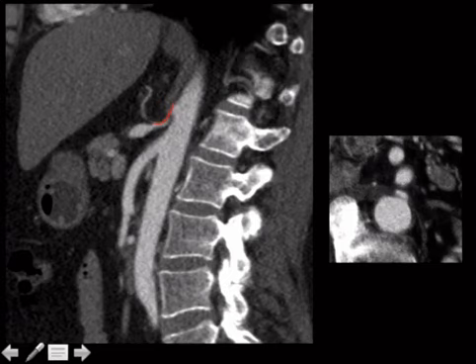Probably have seen this a few times, just going straight down. That's how, if someone was going to show you this particular pathology, that's how they would show it on axial. It's much sneakier on axial. It would be way easier to tell what was going on sagittal. In fact, it would almost be too easy, therefore it might be more likely to see it on axial.